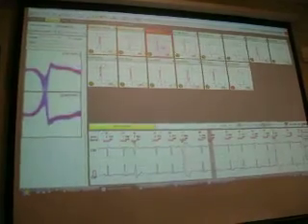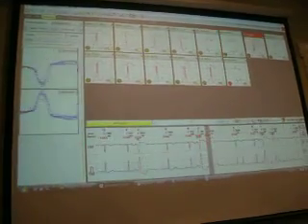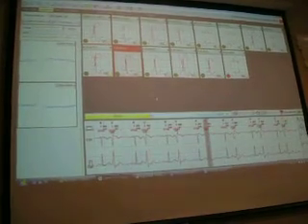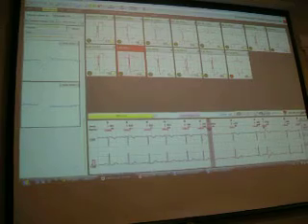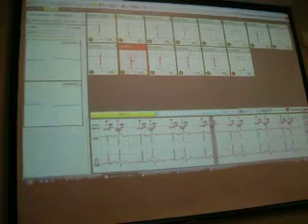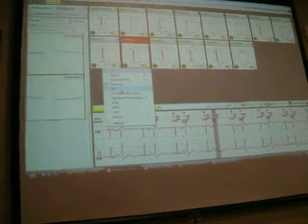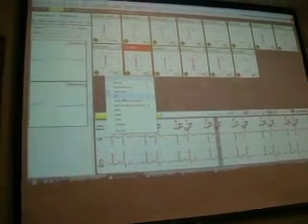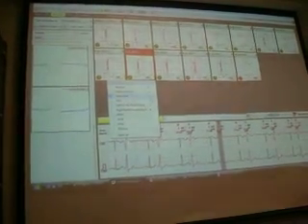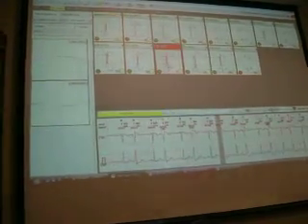This is good. Ventricular, ventricular. This is ventricular. This is ventricular. Correct. Correct. This is correct. And these are questionable, rather fusions. It means a junction between the normal and the ventricular, but in this case I let it be ventricular because there are some similar forms named ventricular.